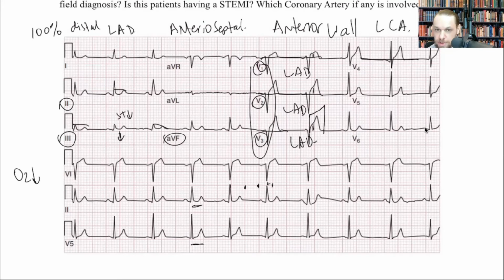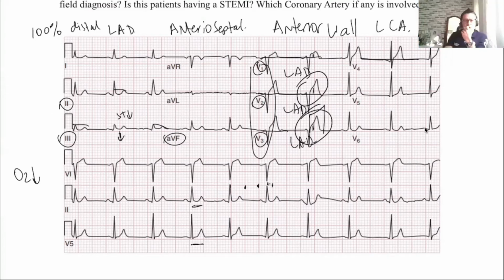For your purposes, you're going to treat them if they're having chest pain. By the way, how many 12 leads should you do in the field? Let's say you come in, you have a positive 12 lead here, right? ST segment, you transmit. Is that the only EKG you do? Could you take off all the leads from the patient and disconnect them from the monitor? Shouldn't it be continuous? Yeah, if you have a patient like this, the monitor stays on them the entire transport.